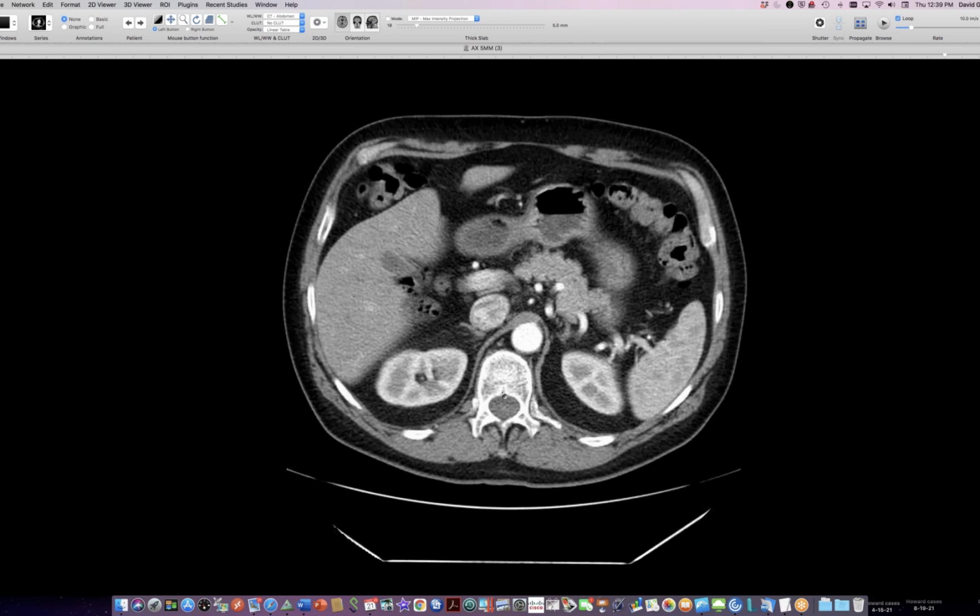So, just looking at this, I would say, well, it's a little thin on that side, but it's not really atrophied, and therefore there is a chance that this is going to get better. It might be weak, but it's not paralyzed. There's still reasonable thickness to this right hemidiaphragm. Now, I hope I can show you the sniff test.